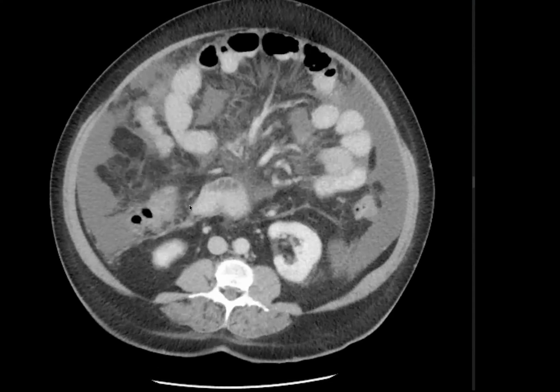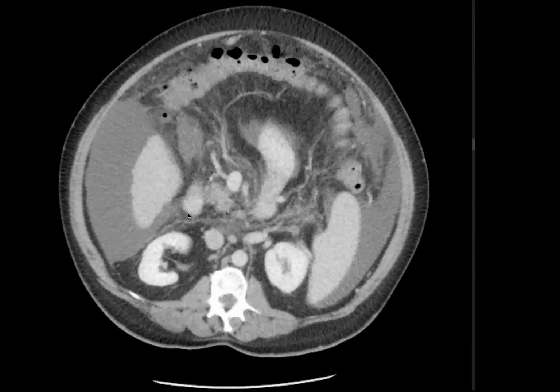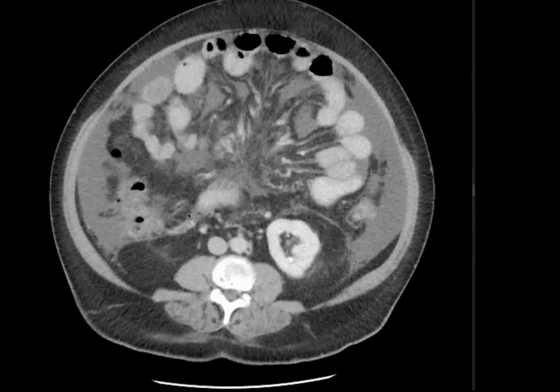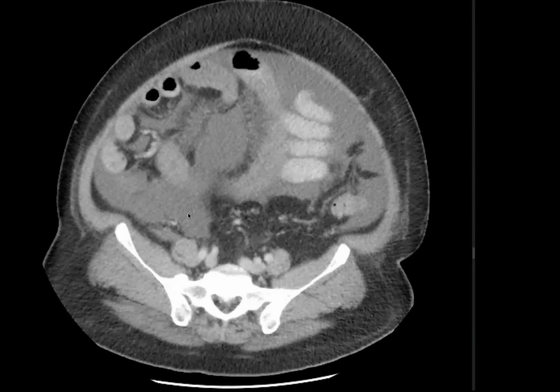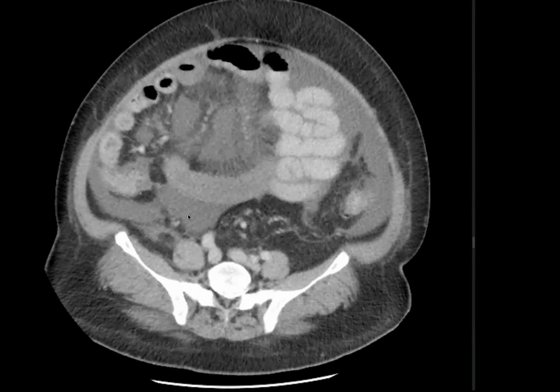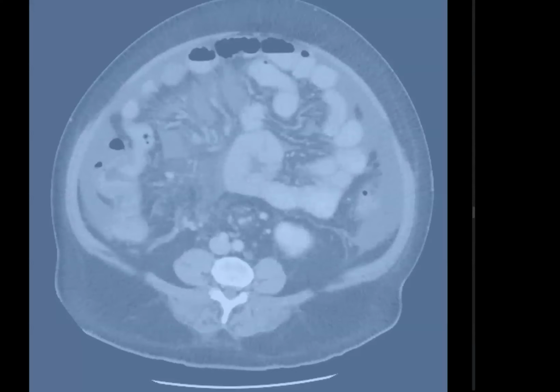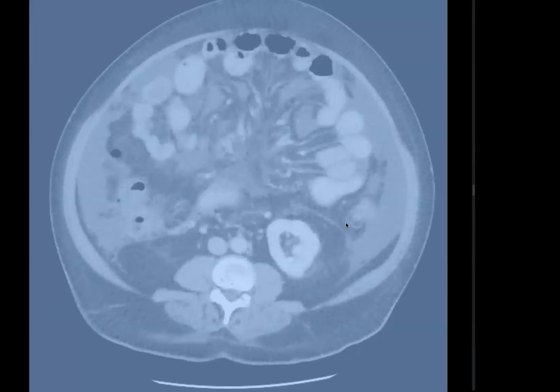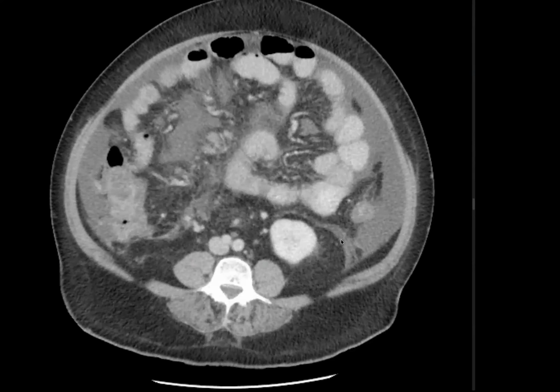I think that was the timer. Yeah, timer for 5 minutes. Should we let him finish and take time from the next case or move to the next case? I think we can give him 1 or 2 minutes more, and then move to the next case. So you were describing the ileal loops for me. Go ahead. Just a second. I think it is easier if you use the scroll wheel, so it stops going blue. I know it interferes with your speed.